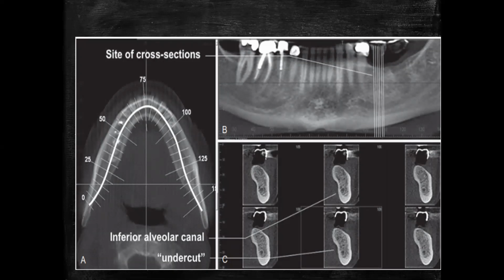Now, there are two things which you need to understand over here. One is the interslice distance and the other is slice thickness. Most radiology reports will provide you, on the bottom side, the slice thickness of this particular report and the interslice distance.